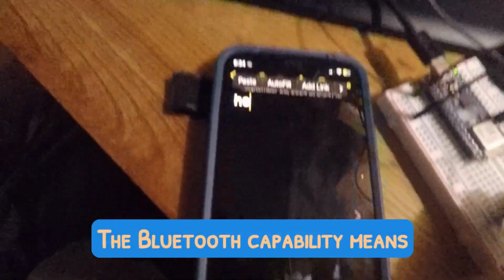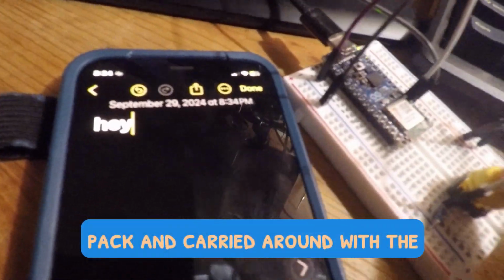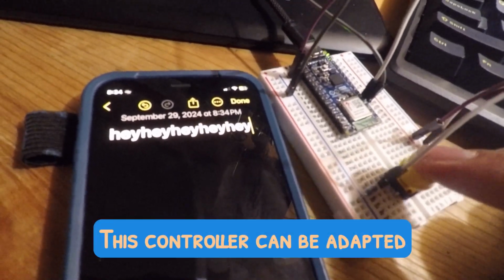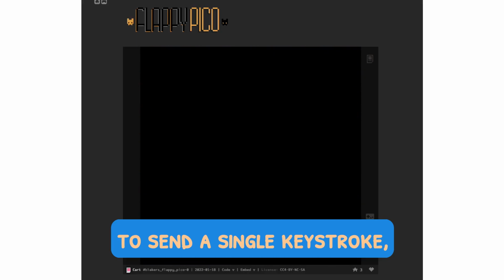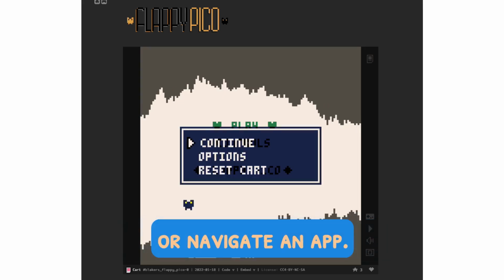The Bluetooth capability means that this Arduino can be connected to an external battery pack and carried around with the device without being tethered to a computer. This controller can be adapted to send a single keystroke, and the iOS program can use that keystroke to play a game or navigate an app.